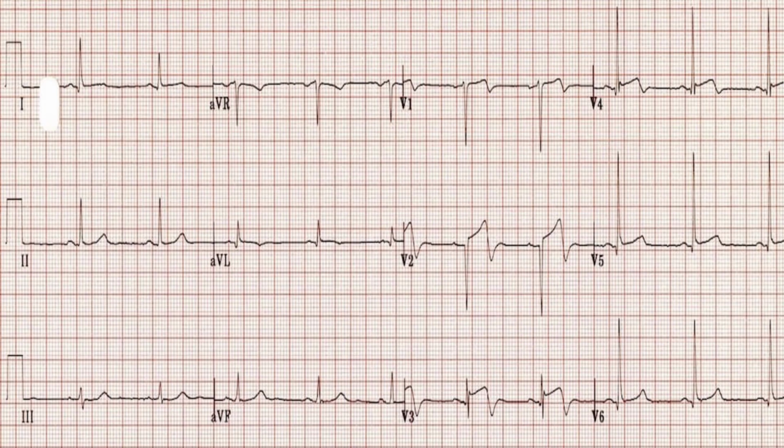Next ECG. See, what we see here is V1, V2, V3, V4 with a biphasic T wave. But here you can also see ST segment elevation in V1, V2, V3, V4, and to some degree V5. So what it means is that Wellens syndrome was already there, but now, due to dynamic alteration or complete occlusion, MI has been precipitated. Now full myocardial infarction is established.